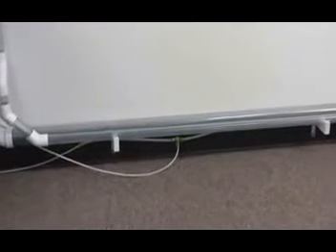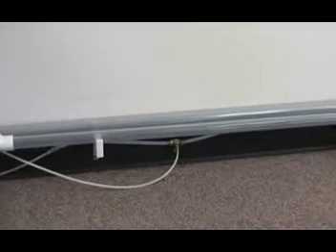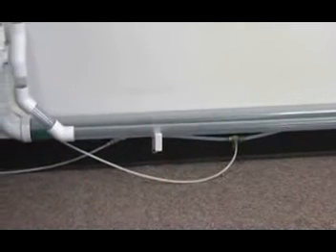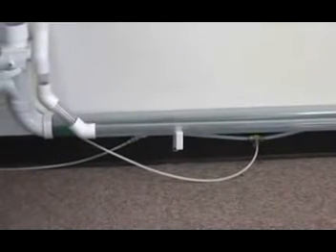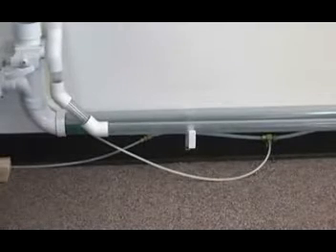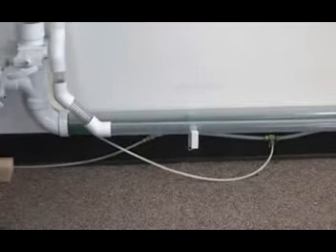As liquids are introduced into the trunk line from the dental chairs, in a normal dental office you're going to have piping that is 1.5 or 2 inch under the concrete. The piping we're going to show you here for demonstration purposes is above ground and clear so you can see what actually happens in the piping.